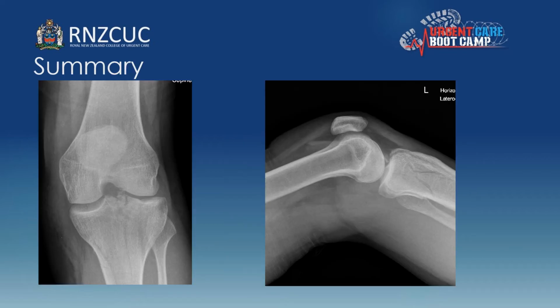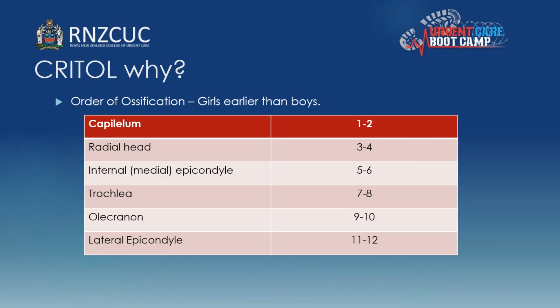So yeah, in summary, ABCs. This X-ray, the same knee, is a good example where you can see that your bony outline and bony contours are definitely abnormal. You've got a good-going lipohaemarthrosis in someone with a very nasty tibial plateau fracture.